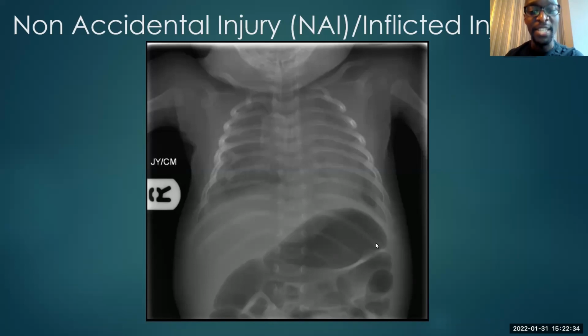Yeah, callus of different ages. Acute and non-acute is really, really important. Thankfully, I haven't actually been called to go to court to discuss any of my skeletal survey reports, but many of my colleagues have. And what we are advised to say is that the fractures are acute or healing, acute or healing. So we don't even try to drill down and say, I think this happened 3 days ago.